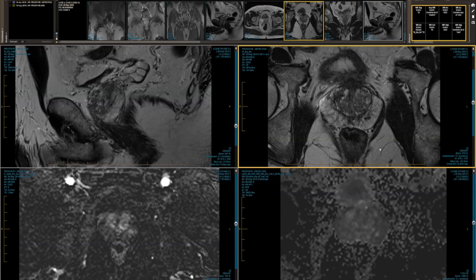I agree. And I don't think the signal's the same right at the base as it looks like there. I don't know. We'll never know, but I think I would have had both of those as targets. I would have had the right and the left as well as the anterior, I think. And this patient didn't have a PSMA PET scan, but that might have been the final arbiter in this case, because even the histology hasn't quite necessarily given us a clear answer.